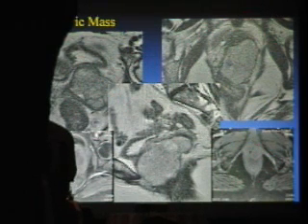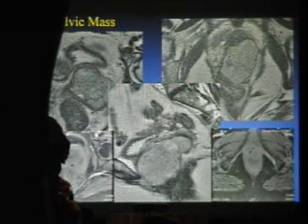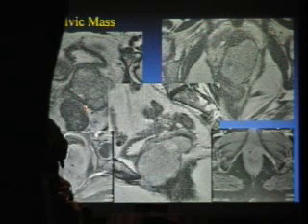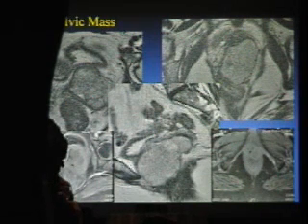This is a vaginal melanoma, the most unusual lesion. I don't expect the diagnosis to be made. The patient came with that pathological diagnosis. But our role is to stage this lesion and to tell the surgeon what needs to be excised. And so here we were able to say that the bladder is not invaded, the rectum is not invaded, and the sphincter is not invaded. So hopefully she can preserve the urinary function and the rectal function. That's going to be a tricky surgery, there's no doubt, and I don't know if they will be able to do that. This was just to be done this week.